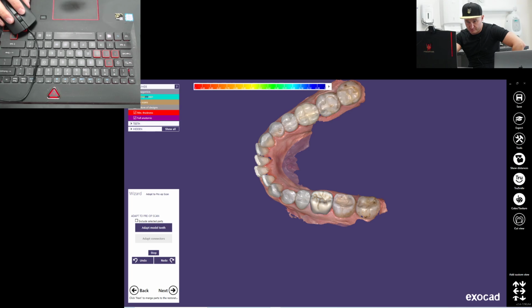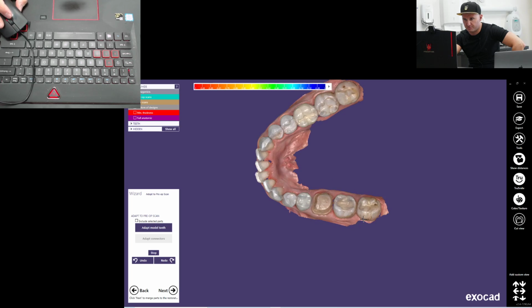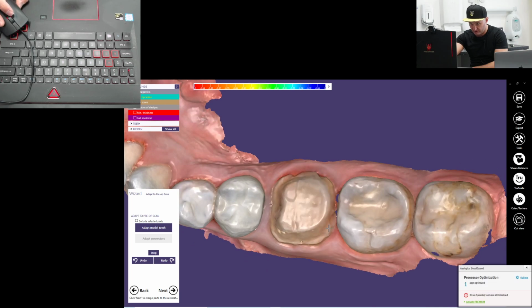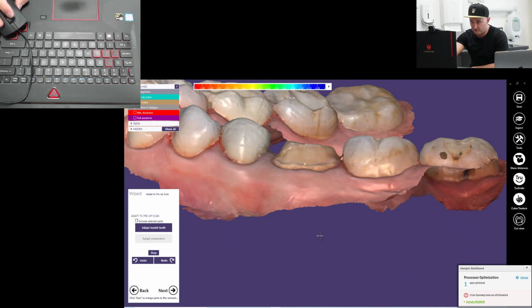I did not have this option because I had already prepared teeth when I started. A patient reported to me because she lost her crown, I think due to the low height of the filler here.